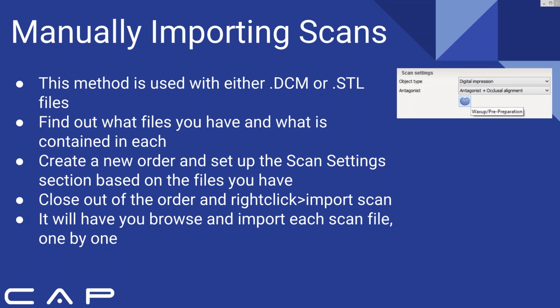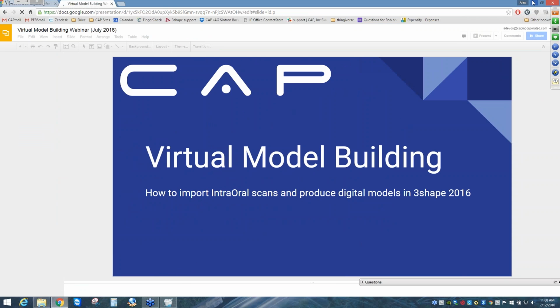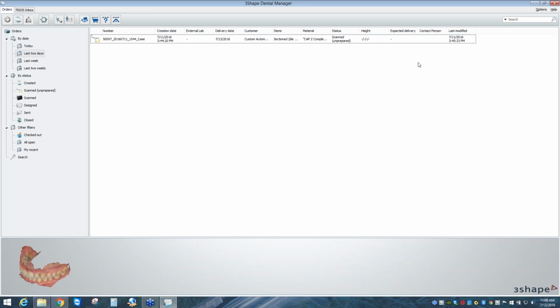So let's get into this now. I'll start off with a new case that I've imported from my Trios inbox.